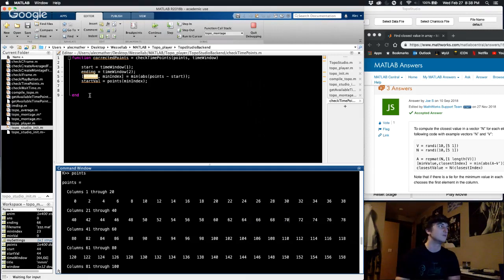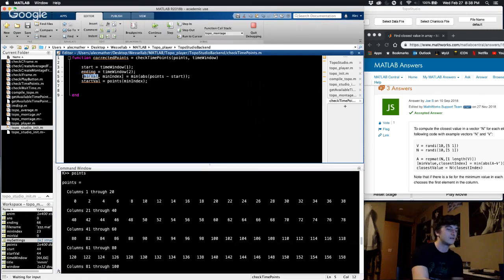So we knew that. Also, we don't need this min val. And then we just do the same thing.